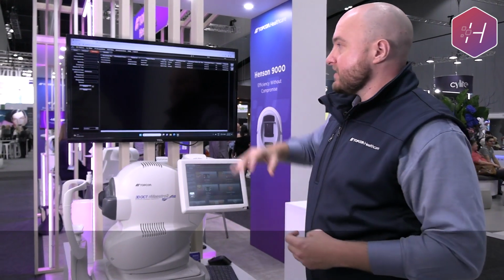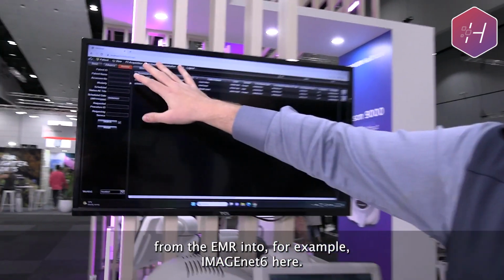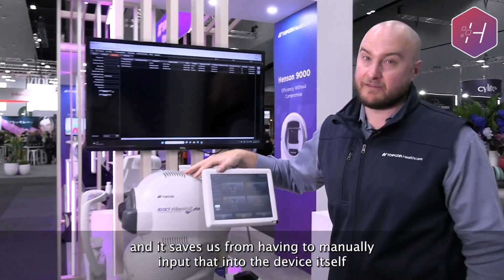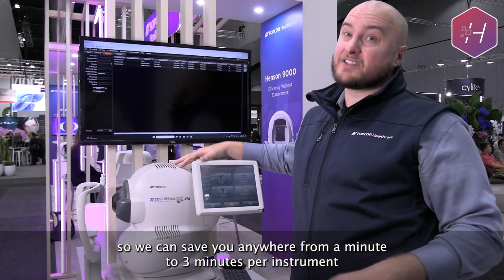As most of you, I'm sure, have a whole diversity of different instrument types, what we can do is bring in all of the patients we've got from the EMR into, for example, ImageNet 6 here. We've got a list of them, and it saves us from having to manually input that into the device itself. So we can save you anywhere from 1 minute to 3 minutes per instrument.